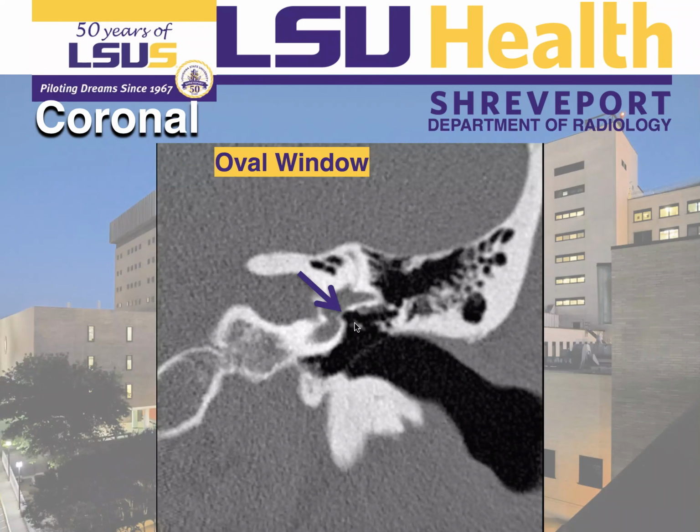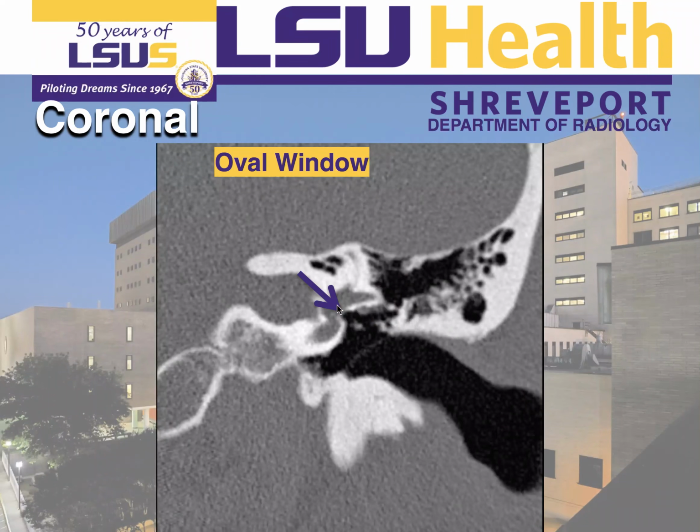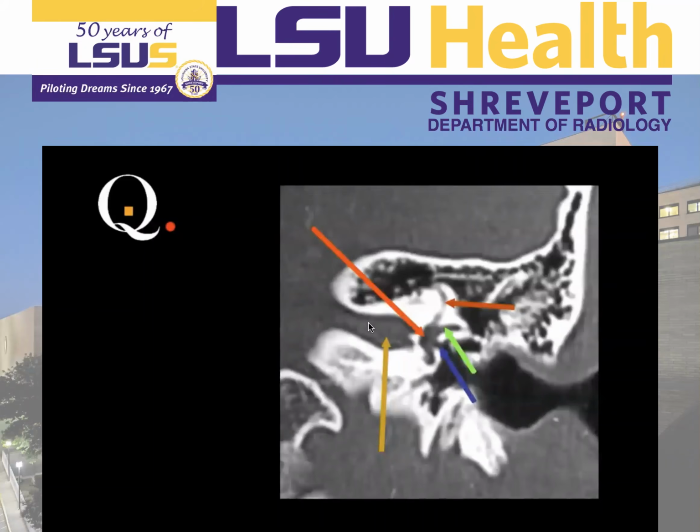Oval window, scutum, and under the lateral semicircular canal, the facial nerve passing. Okay, guys? So ask yourself, do you know how to name all the structures? If you don't know, go back and try to see what that is, and then answer yourself.